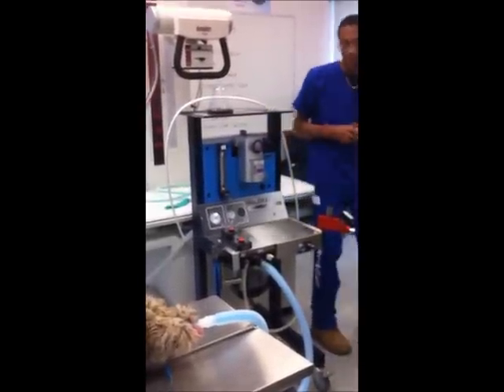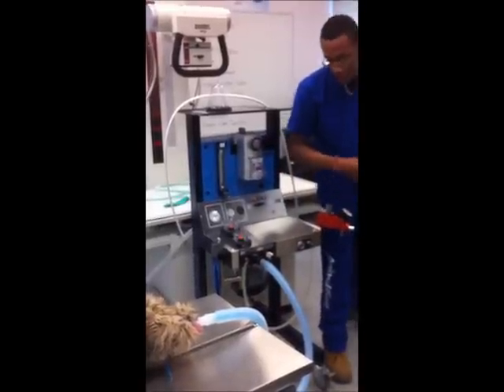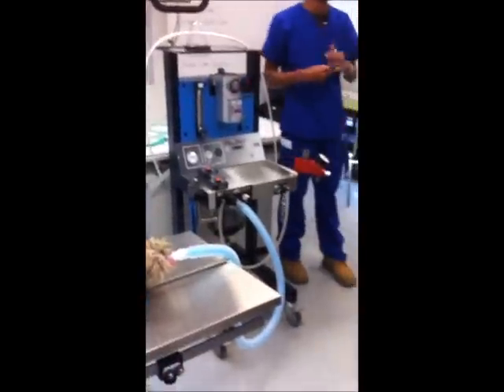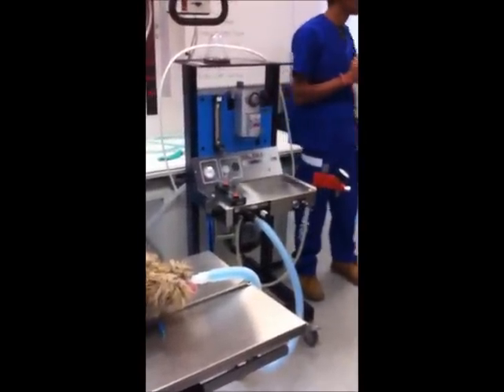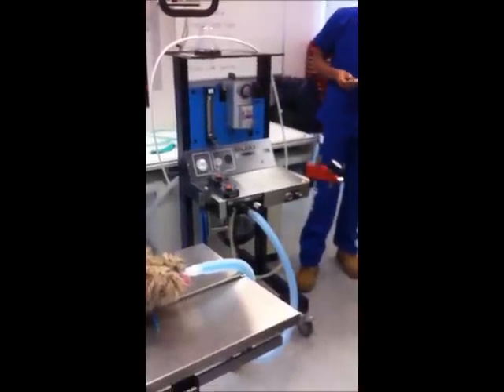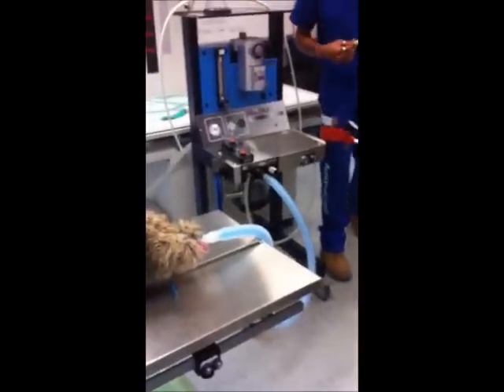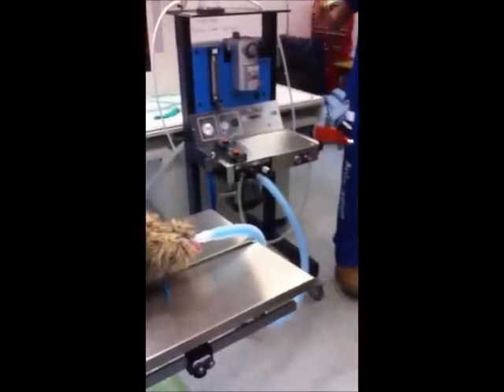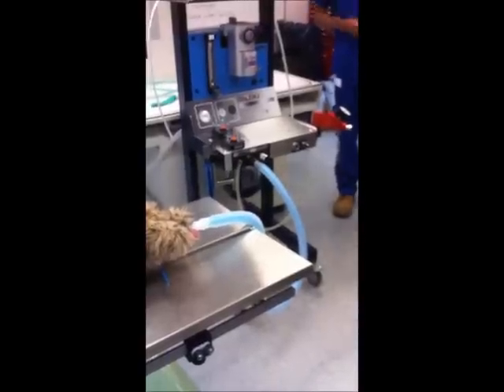So, you now have some fresh gas going to your rebreathing bag. Where's the next stop for your fresh gas now? The inhalation tube. Which one is the inhalation tube? The blue one, the inside one. Good. So from your inhalation tube, what's the next step after that? You have one more: the endotracheal tube.